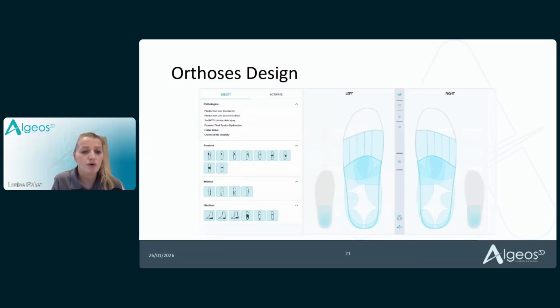The other option that you also have is to pick any individual spec from the forefoot, the midfoot, the hindfoot, click that into the shell, and you can see them appear along this profile here, the picture. So you click on what you're doing, you get a label of what it is, and then you see it appear in front of you. So you get a very clear visual of, yes, this is exactly what I need and what I want. And this hopefully correlates to what you've always done in clinical practice. Regardless of how you prescribe foot orthosis, you're always thinking about the hindfoot, the midfoot, and the forefoot modifications and what impact that's going to have on gait.